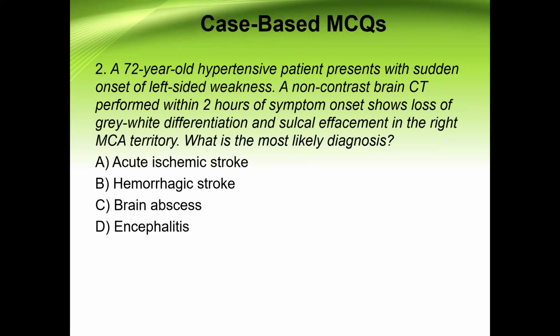A 72-year-old hypertensive patient presents with sudden onset left-sided weakness. A non-contrast brain CT performed within 2 hours of symptom onset shows loss of gray-white differentiation and sulcal effacement in the right middle cerebral artery territory. What is the most likely diagnosis?